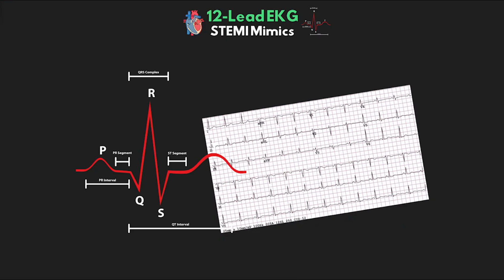All right, you guys, we are getting so close to finishing up this amazing 12-lead EKG series. The last lesson we talked about ST elevation and specifically when it relates to AMI. But we can also see ST elevation for other reasons than an MI, and it's important to recognize these. So in this lesson here, we're going to talk about our STEMI mimics.